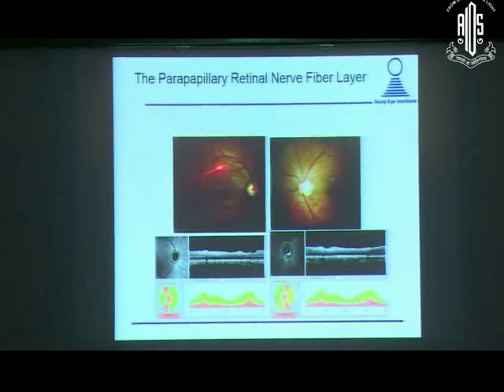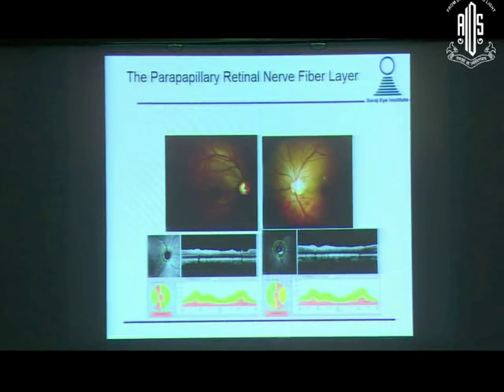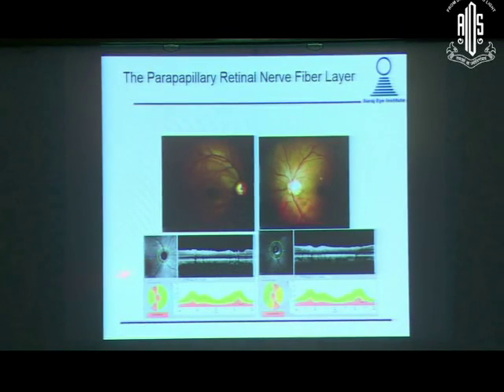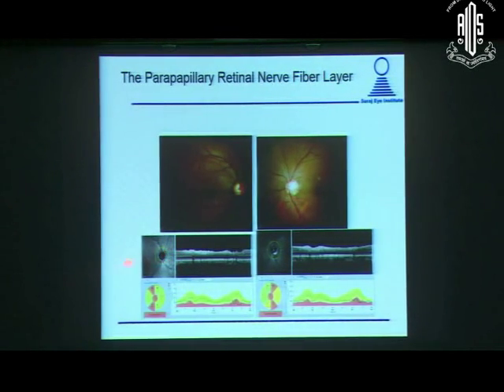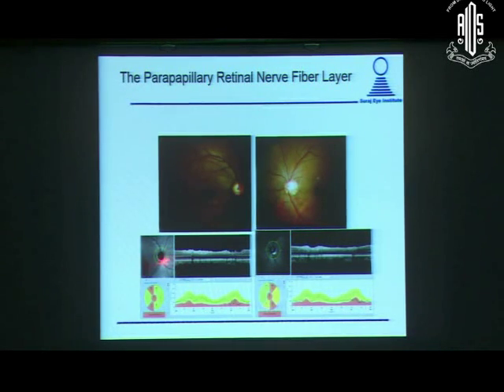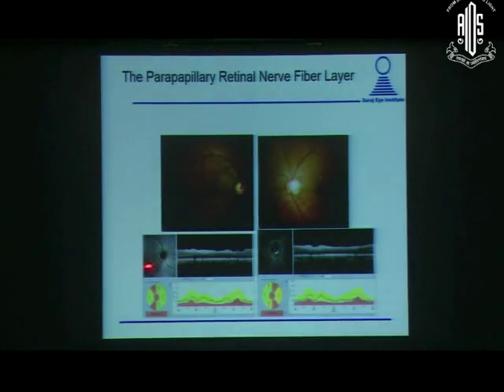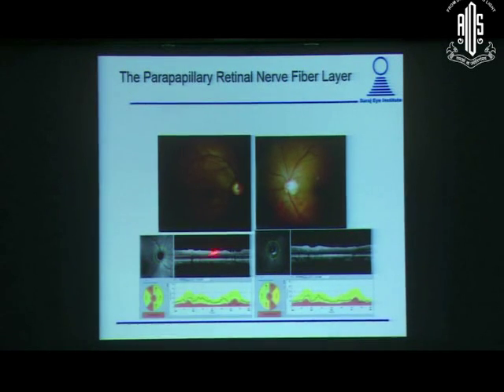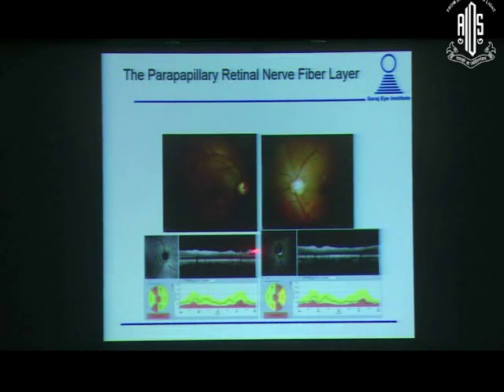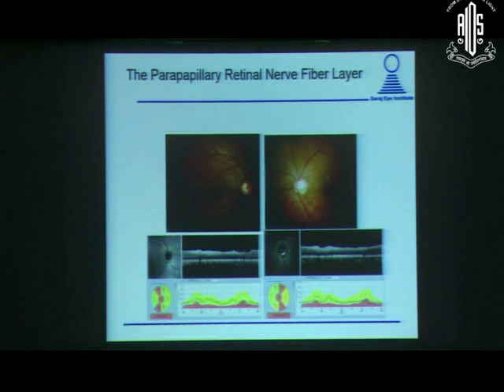There are retinal nerve fiber layer defects both superiorly and inferiorly, and the retinal nerve fiber layer is not only assessed simply by looking at this red and green, but you also look to see whether it's circled, whether you're using the foveal optic disc alignment, or whether you've gone on to the new software that's been released, where it's not the optic disc alignment, but the foveal Bruch's membrane opening alignment. You also look at the tissue of the retinal nerve fiber layer, and you can see a classical retinal nerve fiber layer notch that corresponds also to the notch that you see in the optic disc.